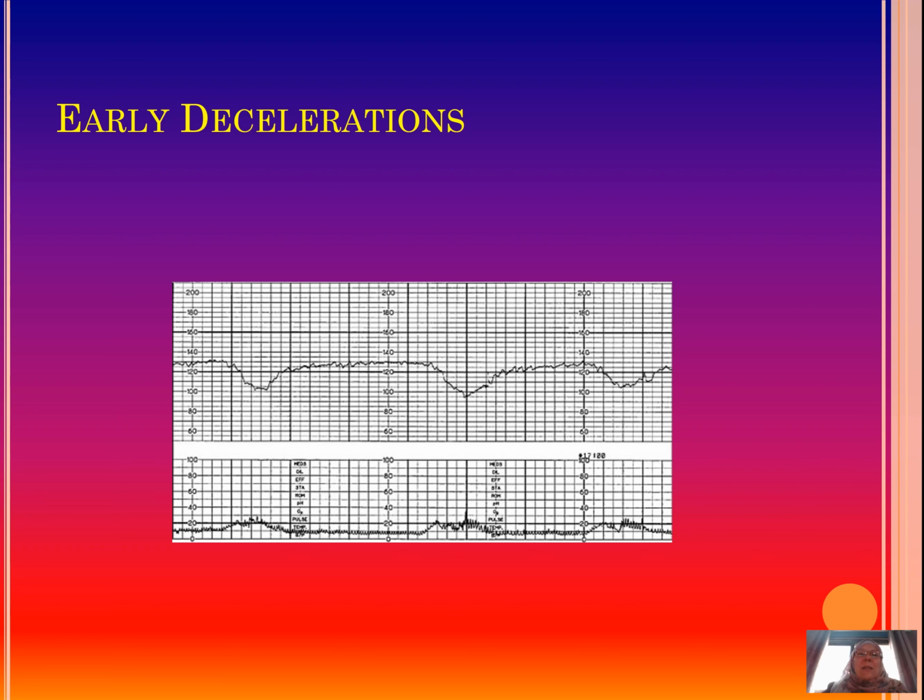In fact, early decelerations are very rare to find. You will hardly see them on a CTG. They are an expression of what? That's right, they are an expression of fetal head compression and are a benign feature on the CTG. So they do not represent a major abnormality.